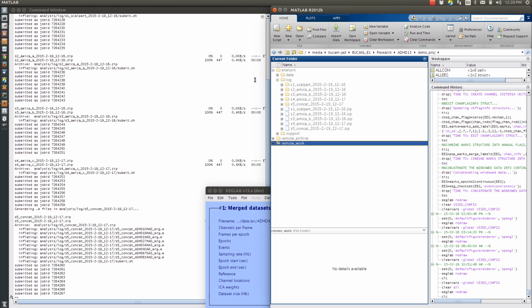But also this folder containing the scripts and the configurations is all that we would need to form a repository for sharing this procedure, so that really anyone can then just take this folder, put their own data into it, modify the context to reflect their compute resource remotely, modify the batch configurations to run the scripts the way that they want, and then be able to execute it at the same speed.